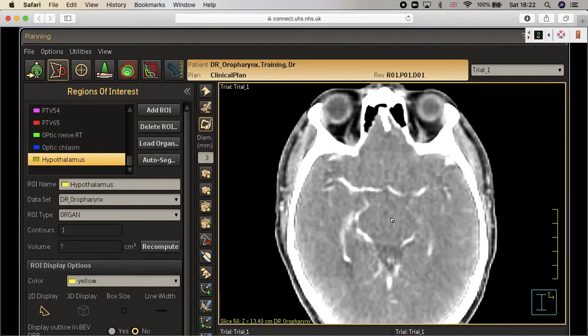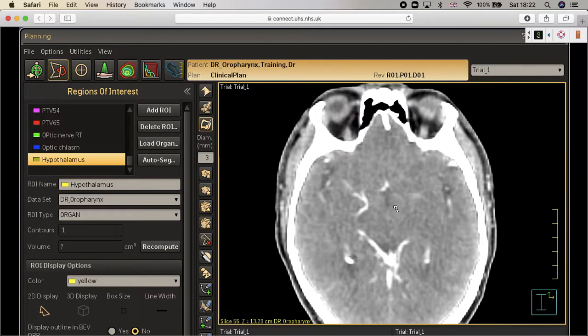My landmark for the hypothalamus will be the optic tract, honestly. So this is the optic tract here. In between the optic tract, I will draw a structure, two limbs. Don't take the optic tract, okay? Just draw a structure like two limbs on either side, and I will call this the hypothalamus. I'll show it to you in the MRI, and then you may believe me on doing it, okay?